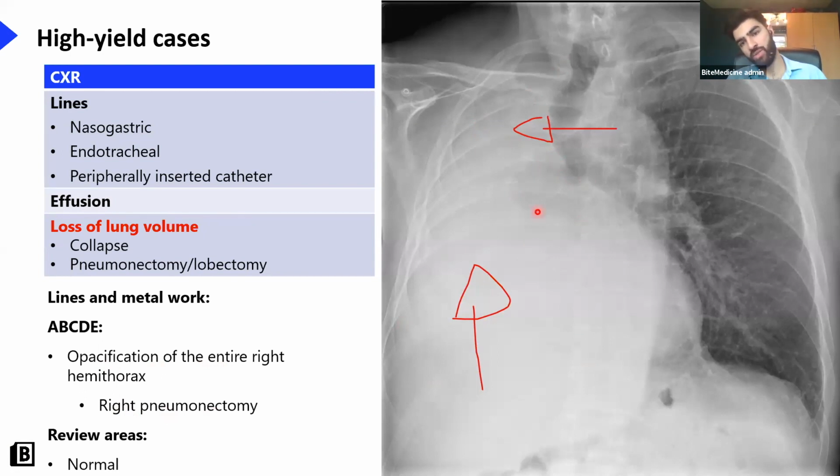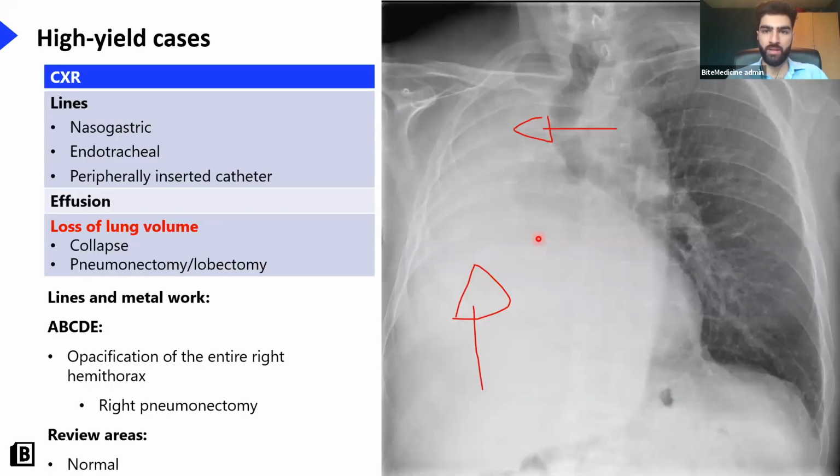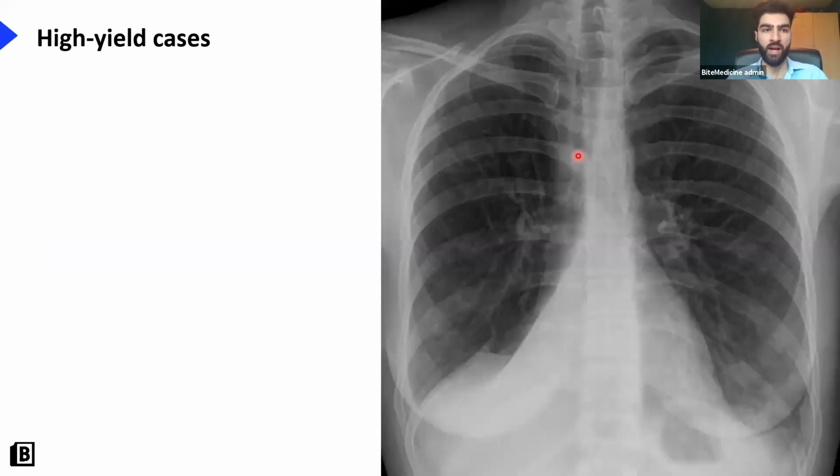You can't really see the right bronchus too well. It might be there. It might be obscured by the overlying fluid, or maybe part of it was taken out. Okay. Someone's asking, what's the dark tube at the top? So this is the trachea, if that's what you're talking about. I can't see any other tubes, but we can come back to that later at the end.